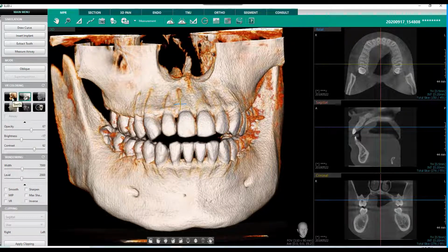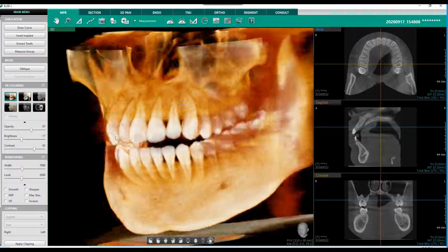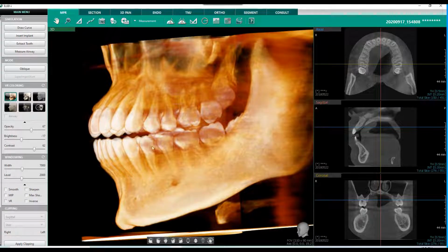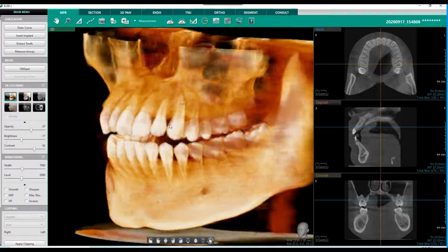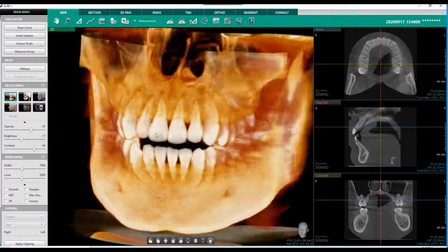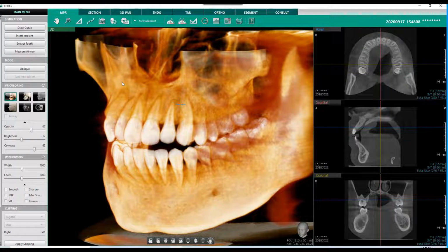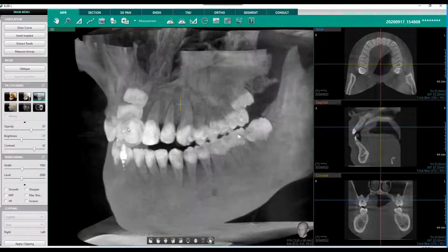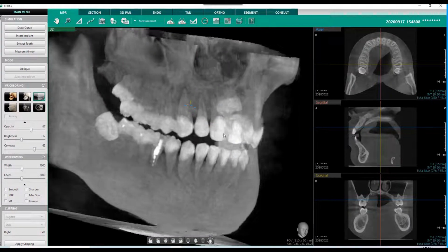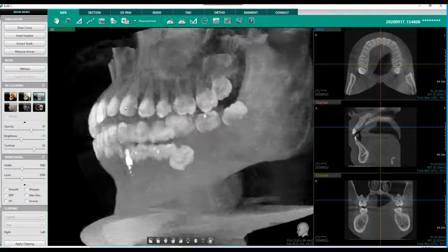I'm going to go over to my VR coloring and select teeth. This will highlight just the tooth structure, where we can get somewhat of an overview, looking at our impacted 17 and 31, also looking at 1 here, kind of going through the overall scan itself from a virtual rendering point of view. Another tool I use here is this MIP, which is maximum intensity projection. Go ahead and click on my MIP, and that's going to change it over to more of a grayscale. So we see we have RTC right here, and we can go ahead and rotate through.